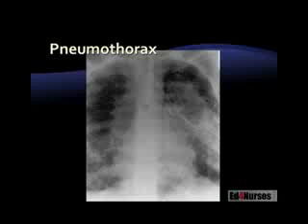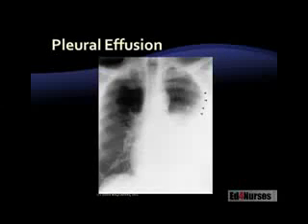And what it's pointing to is a line. See that line there? I highlighted it for you. That line on the left side of the line is brighter than the right side. And it's a very distinct line there between the darker area on the right upper and the lighter area on the left lower. And that is a pneumothorax. There's air up in that spot. There's not lung tissue. There's air up in that spot. And that is a pneumothorax that's occurred.